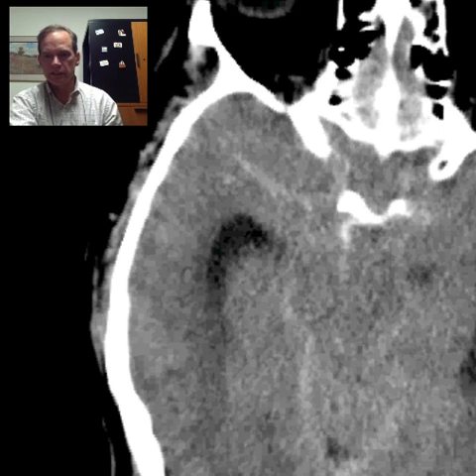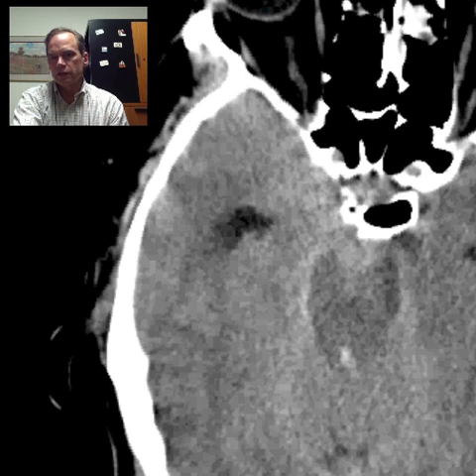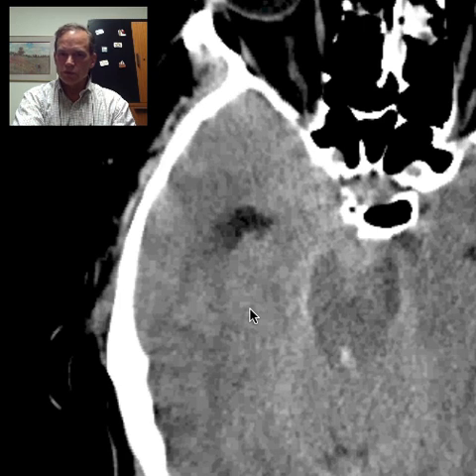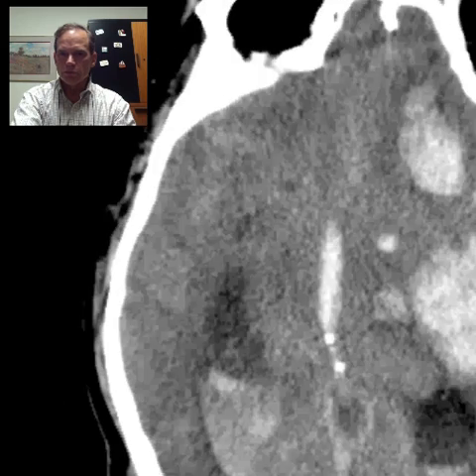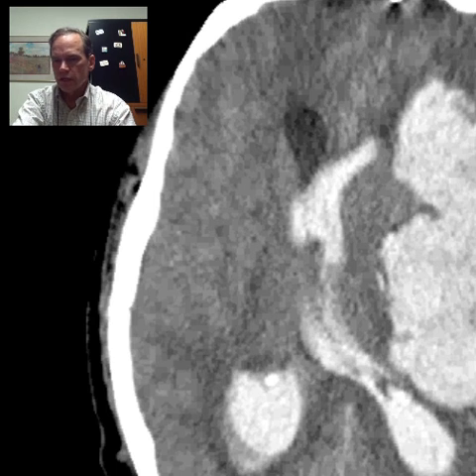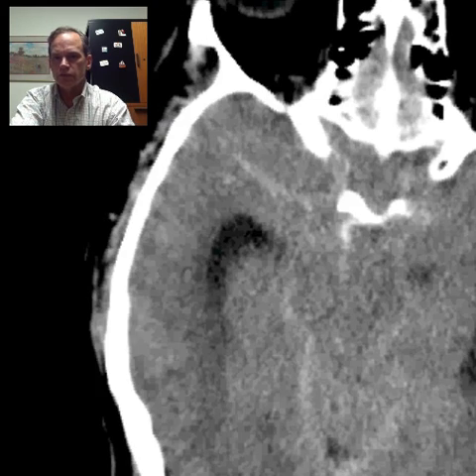The midbrain specifically at the level of the cerebral aqueduct and the cerebral peduncles. And if you look here, what you see here that may not be as striking is the fact that the midbrain is pushed over to the right. And this goes back to the subject I was alluding to before. You can have gangbusters of hemorrhage up here in the hemispheres and still survive and recover a great deal of your function if intervention is early and successful.